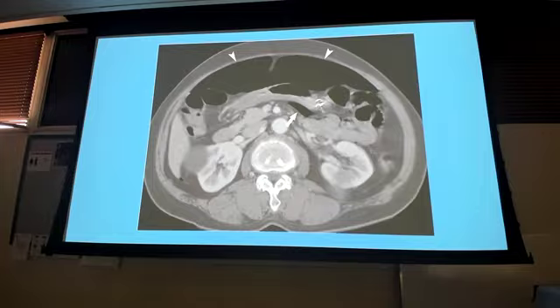What's this thing here? Cyst on the kidney. Right? What organ is this? Kidney. Cyst. Right? So how do I know that? Well, now I know that's the kidney. Hey, just out of curiosity, right or left kidney? Right kidney. Remember, opposites. Opposites, okay? Your left is their right. So right kidney, and then I have this growth kind of off the kidney. I can see it. It's like cutting into it here.